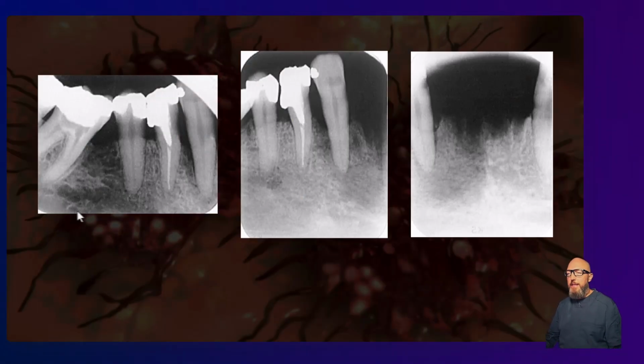Now showing you some examples of those. Here we have a radiolucent lesion. I would say it looks somewhat well defined, but when you have ragged borders, then you're thinking more along the lines of categories that are similar to ill-defined. So think of your inflammatory, think of your malignancy. This could be malignancy. What I notice is it communicates with the PDL space here, and the PDL space is normal, completely uniform, and there's no evidence of PDL space widening like we talked about in the malignancy lecture.